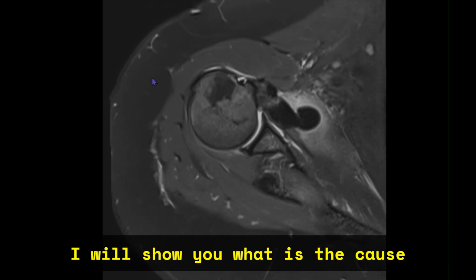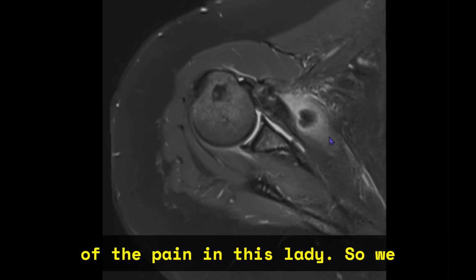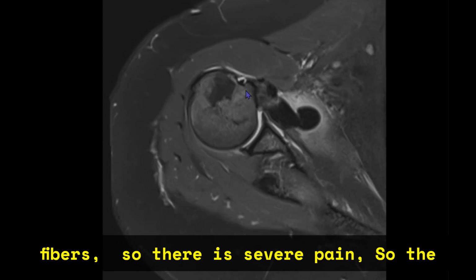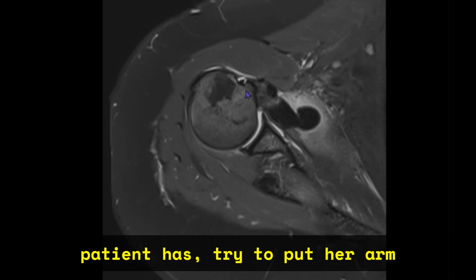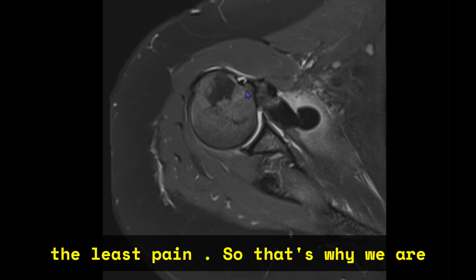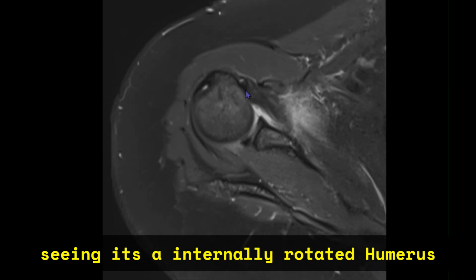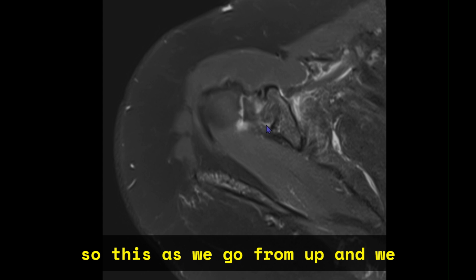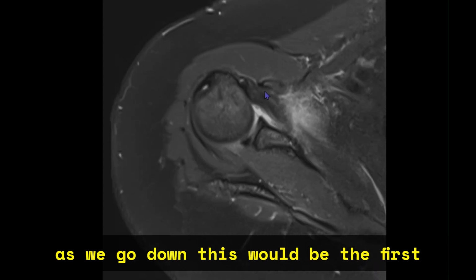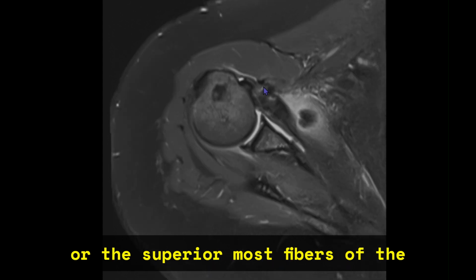Now I'll show you what is the cause of the pain in this lady. So we are seeing that these are the insertional fibers. There is severe pain, so the patient has tried to put her arm in the position where she is experiencing the least pain. That's why we are seeing an internally rotated humerus. As we go from up and we go down, this is the coracoid process, and as we go down, this would be the first or the superior-most fibers of the subscapularis.